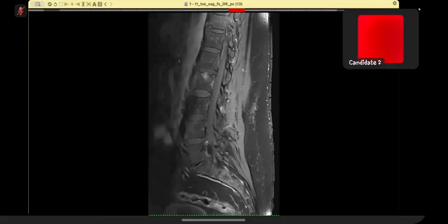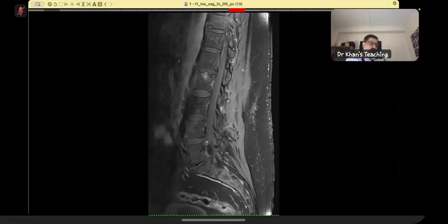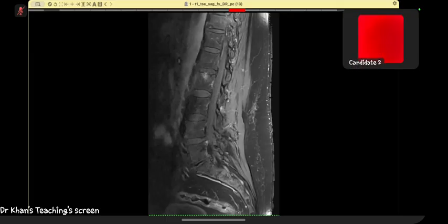Okay, so other differentials could be that it is a case of spondylodiscitis in its early phase. I would correlate with any CRP or inflammatory markers, or any raised white cell count. What is your final conclusion? So what will you advise? My final conclusion is I would like to look at an X-ray as well to correlate for this finding. I am asking you for the conclusion. At this point, you can ask for it. Give me the conclusion.